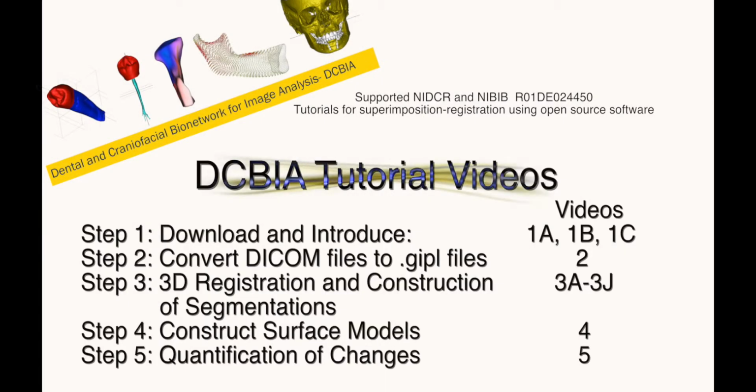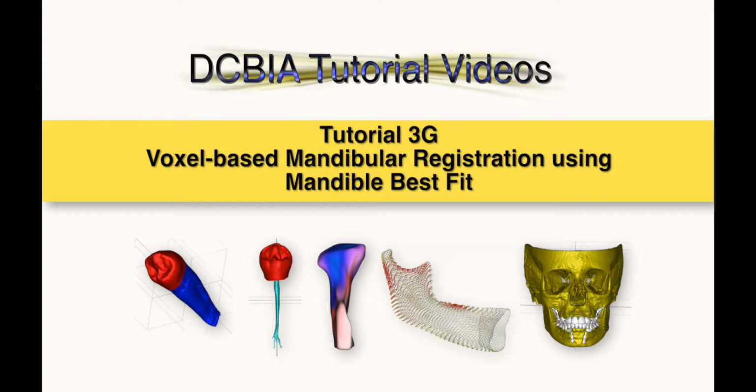Applying the voxel-based registration at the mandible best fit is the first step after the approximation of the scans, either with transforms or landmark registration and the construction of the mandible segmentation. The next step would be to create the segmentation of missing areas and construction of color maps.